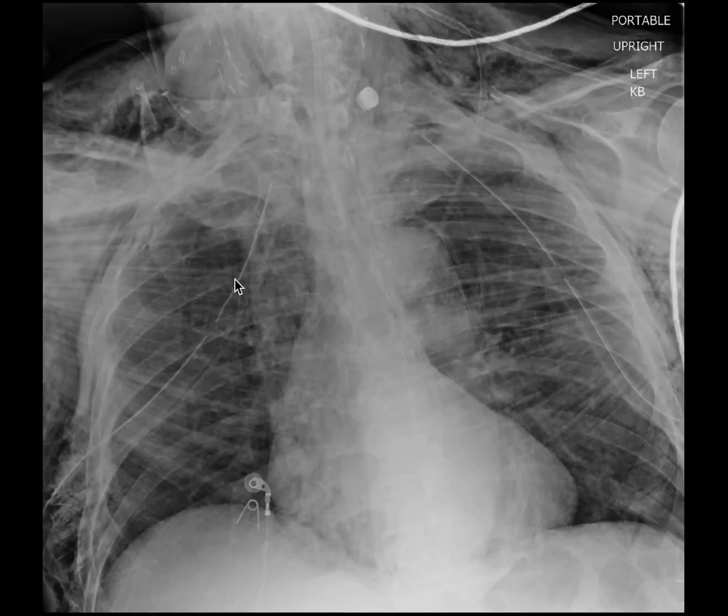And notice the break in this line here. This is the sentinel hole, or the last hole. You see it on both sides here. This must be within the thoracic cavity for the chest tubes to function. These are both well within the thoracic cavities. And if you think this is impressive, wait till you see this next film.